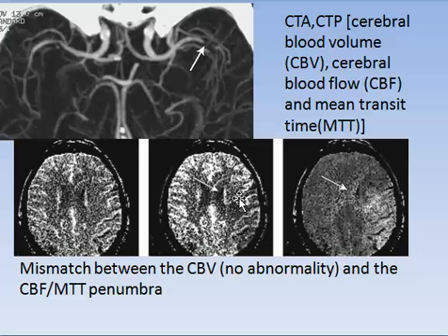So this whole cortical area is salvageable, while this is the core of the infarct, and MTT confirms the same process. This is the MIP, maximum intensity projection image of CT angiography, showing the left middle cerebral artery occluded along its transverse segment before giving the curve of the opercular branches.